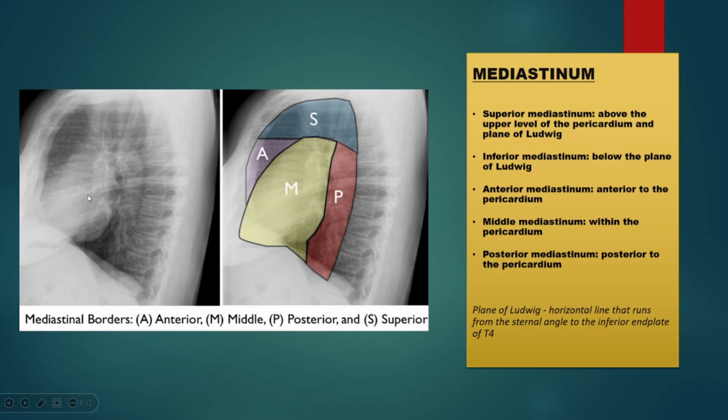The retrosternal space and the retrocardiac space here are of similar low density. That is also important factor. Sometimes certain pathologies can obliterate this low density areas.